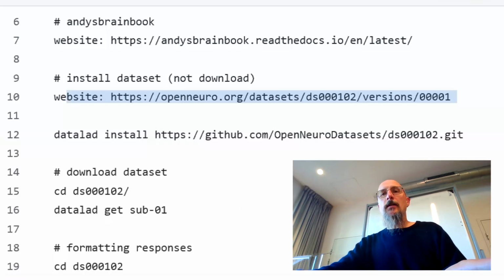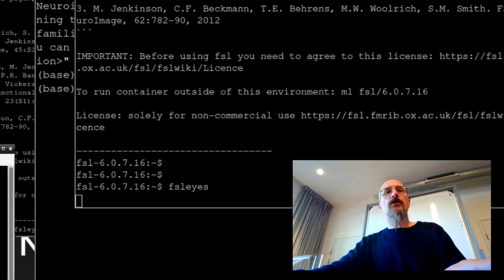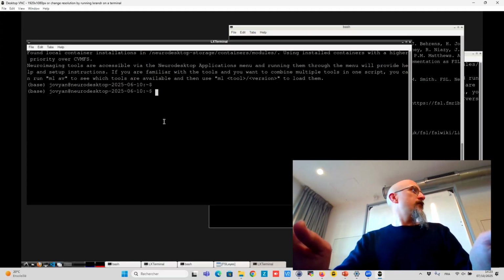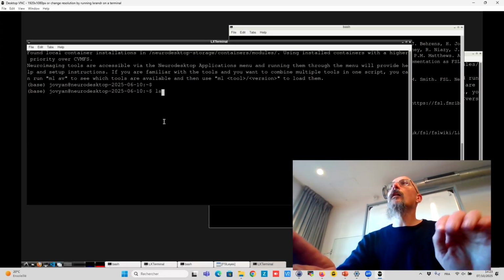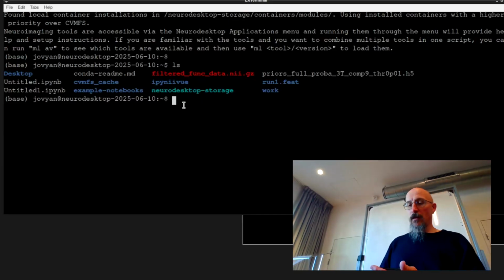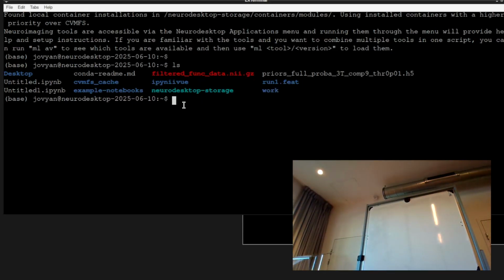Let's close that, I don't need that. On your desktop, now I have FSLeyes. Let's start a new one. You open a shell. For those who are not familiar with the shell, that's why I asked you the question this morning. If you want to list what is inside the directory, you do ls, which gives you what is inside the directory. In blue you have the folders, and in gray you have the files, okay?